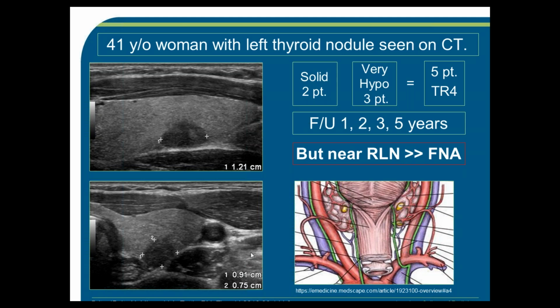So in this particular location, it's important to be more aggressive. And in this case, an FNA is probably necessary to confirm, first of all, that it is a malignancy, and then perhaps to be more aggressive in approaching your follow-up or referring to surgery.